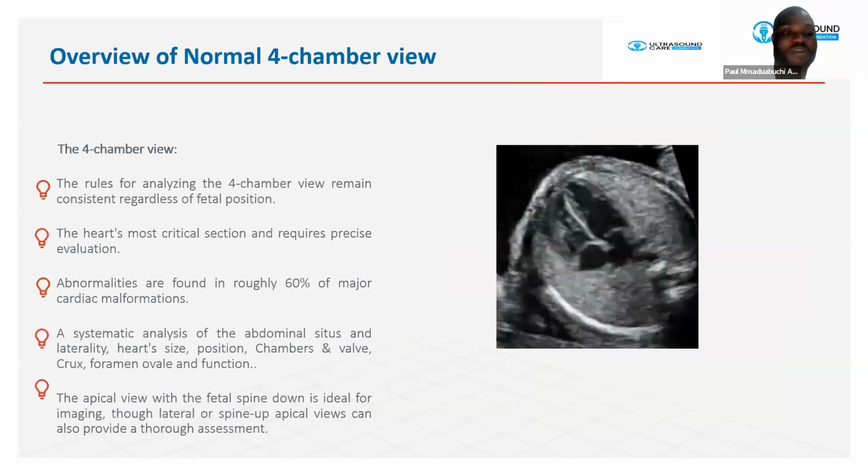So when we come to the overview of the normal 4-chamber view, it is very important that we know that the procedure for imaging the fetal 4-chamber view should be consistent regardless of the position of the fetus, which could be cephalic supine, cephalic prone, breech supine, breech prone, or transverse. No matter the position, it is very, very important that the rules are maintained.